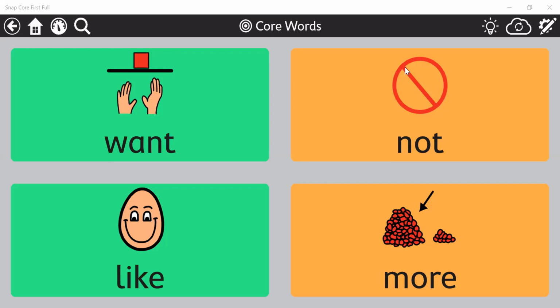I also tend to use support navigation for children who are new to alternate access methods. So think of eye gaze or a head mouse, because it provides them with nice large targets, as you can see. It gives them some nice easy early success where they don't have to work so hard to hit the buttons, and helps provide some of the buy-in and motivation to be successful with that.